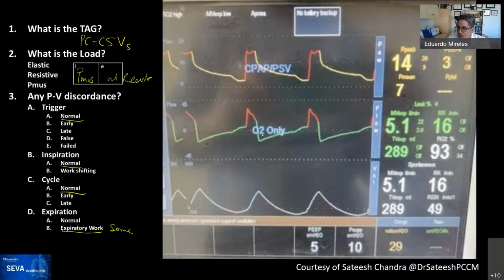So now that I have shown you that, what do you think is happening? It is interesting. My first thought would be that the patient makes some extra expiratory effort at the end, but if that happened, then you would think that the pressure would go up rather than down. So that doesn't make sense. So it's almost like something is released at the end. I think some CPAP machines have an expiratory release programmed in. I don't know if that has to do with this, because this is probably not a CPAP machine, it's probably a ventilator.